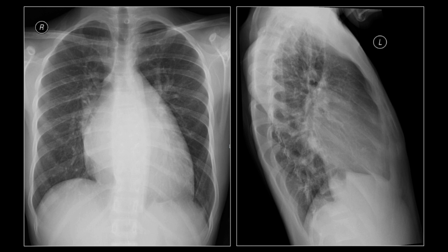An ASD does not typically give you dilatation of the left atrial appendage. However, a VSD, ventricular septal defect, and a PDA, patent ductus arteriosus, may give that, with VSD and PDA being conditions that are more likely to be encountered in patients who are even younger than this case.